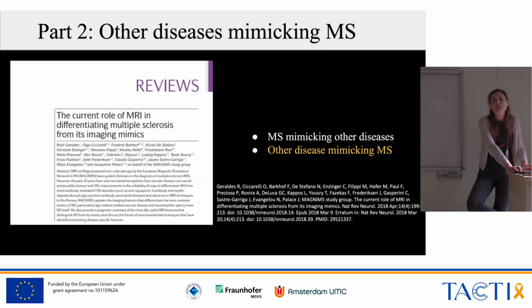So mainly it's tumor and infection also. In Holland, we see very rarely brain infections of CNS invasive agents, but it can happen. I think an important addition can be the duration of the contrast enhancement.